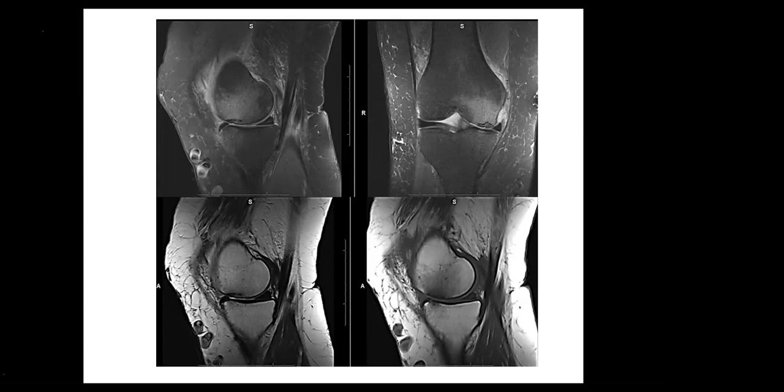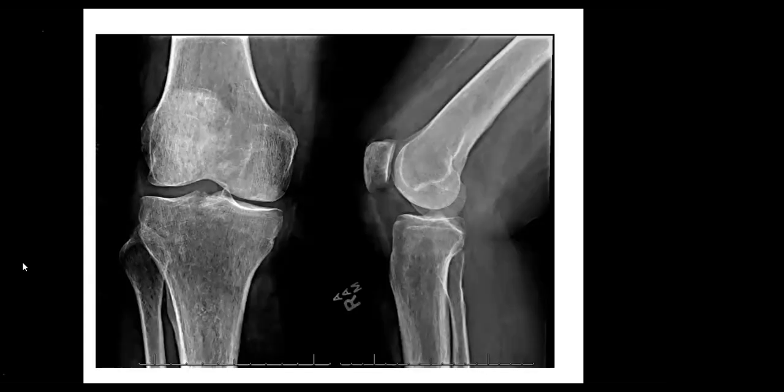Okay, you did really well. You described the subchondral sclerosis here in the medial femoral condyle, which I'm really impressed by. That was very subtle, not an easy radiograph, to be honest with you. It's a difficult one, and I wouldn't be disappointed if anyone missed the subchondral sclerosis, but it's a subtle one.